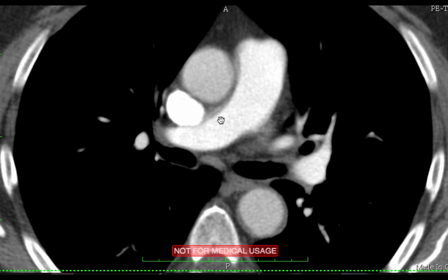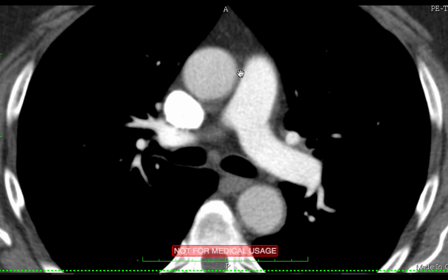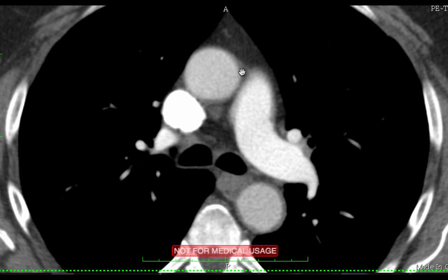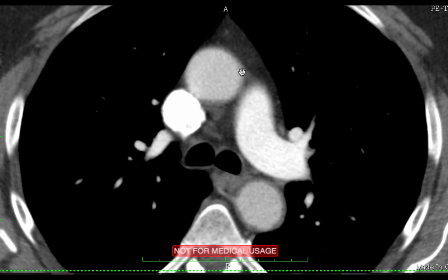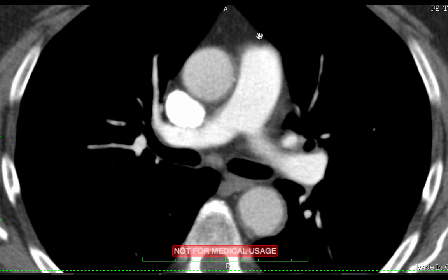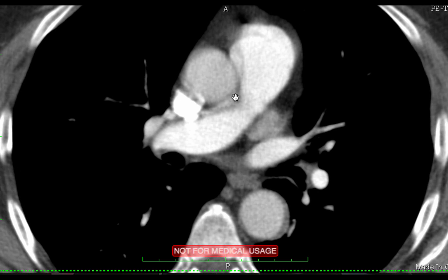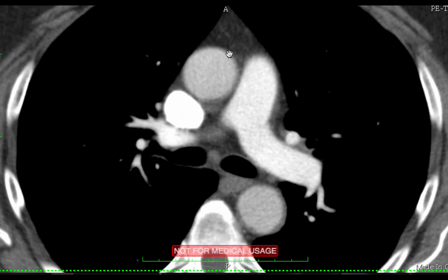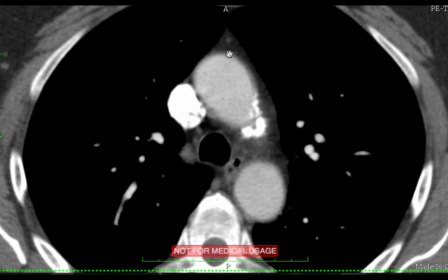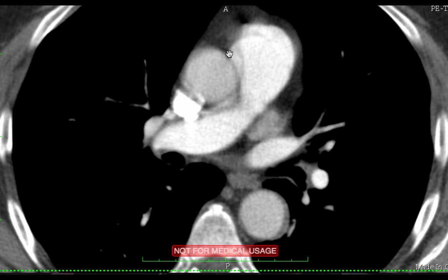And it's at that interface that this barrier, this separation is formed, and it is the reason that this relationship exists. So what you're seeing is a leftover of one big artery that has a septum that was formed in utero to divide the pulmonary from the systemic circulation arterially, and that's how this gets this appearance.